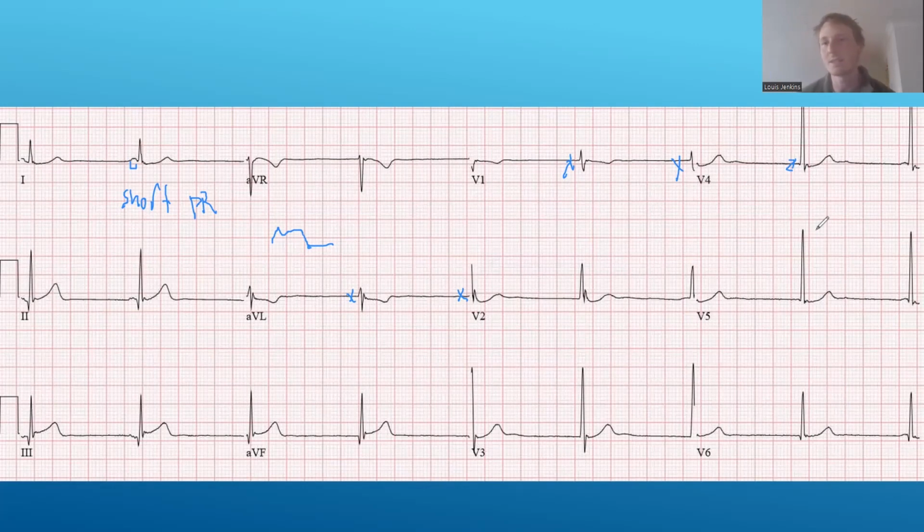And the fact that there's disease of the SA node, we know the SA node is perfused by the RCA, the right coronary artery, so that might give us a bit of a clue as to what could be going on here. But this is all very speculative for me. You might have a better idea as to what's going on here, and if you do, I'd love to hear it, because like I said, this is ideally a bit of a back and forth.